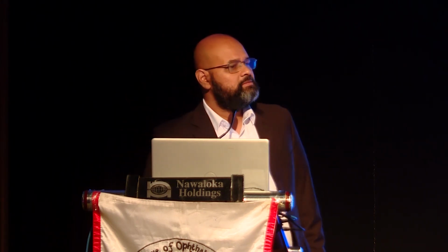Yes. What does this give an idea? What part of the imaging suggests? Chiasm is involved, posterior part of the optic nerve is involved. Okay. What does the imaging suggest? Come again? NMOSD. Yes? Is it NMOSD? Optic nerve is involved, posterior part, chiasm is involved. Imaging suggests NMOSD, right. Does the history suggest NMOSD?